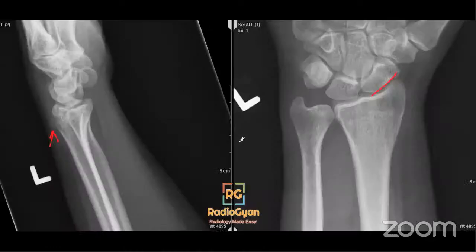And again, make sure that if you see one finding, and if you see the follow-up radiograph, the triquetral fracture is not appreciated much, and it's probably healed, but this is the fracture that's concerning. On the frontal projection, it's difficult to appreciate, but it's definitely seen on the lateral projection. So make sure that if you see one finding, you don't ignore the other findings on the film.